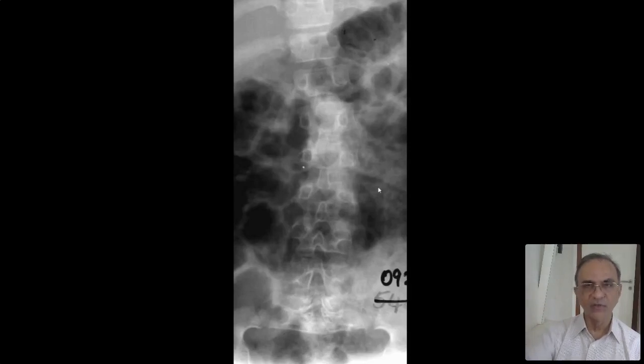So in those difficult situations, you look at interpedicular distances, and look at L3, and look at L4. L4 without using a ruler. You don't often have to use a ruler, not required, eyeball. So L4 is smaller than L3. In fact, the rule is if L4 is not larger than L3, if it is the same as or smaller, often it is smaller, this is achondroplasia.